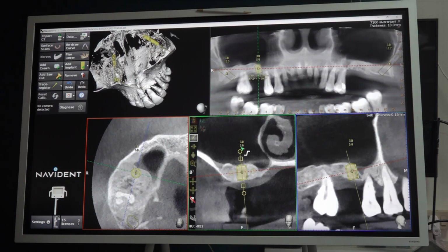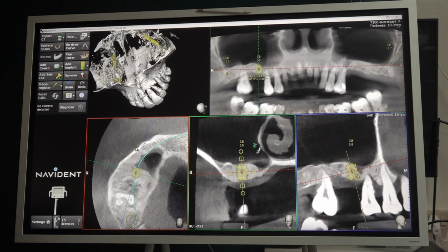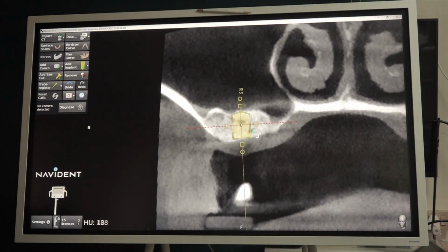Those days it becomes flat, you see. Do you want to disturb the structure of the implant, or nothing? No, nothing. See here, distal to 5. Maybe some bone there, right? I think it's okay. 4.2 into 8 mm. Oh, it should be 6, right?